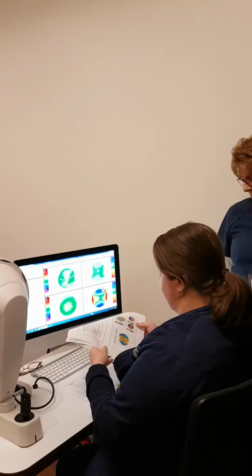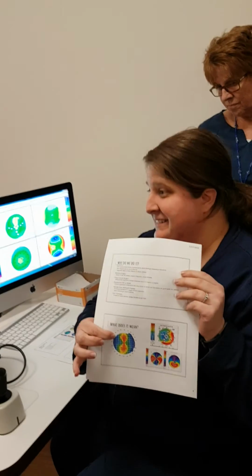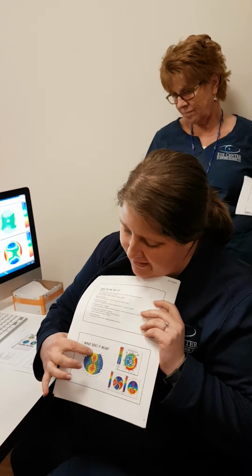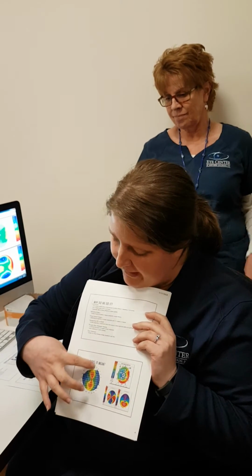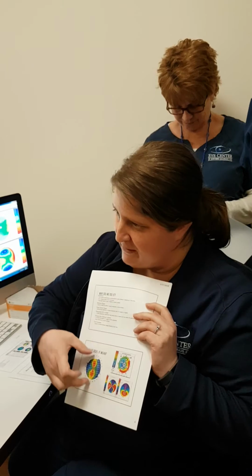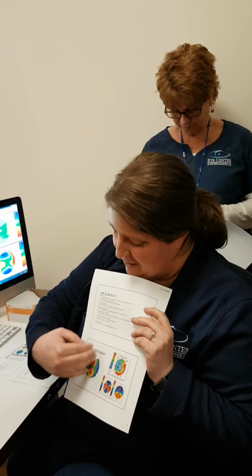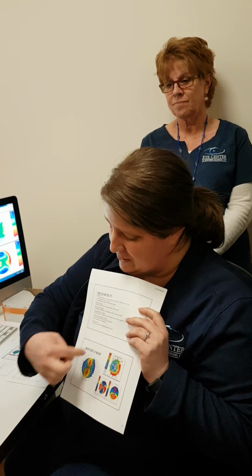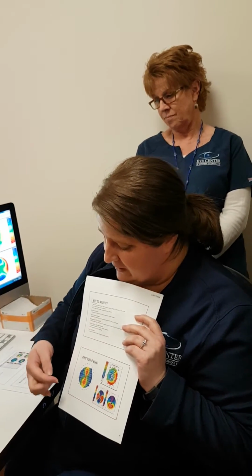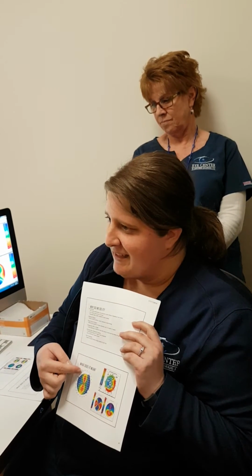Okay, well, this is a perfectly regular cornea, but this would be the steeper area, so the doctor would potentially remove sutures here. Obviously this is the steeper area, so we try to remove these in order to flatten out the cornea a little bit more. But you're never going to get a PKP patient that looks like this.